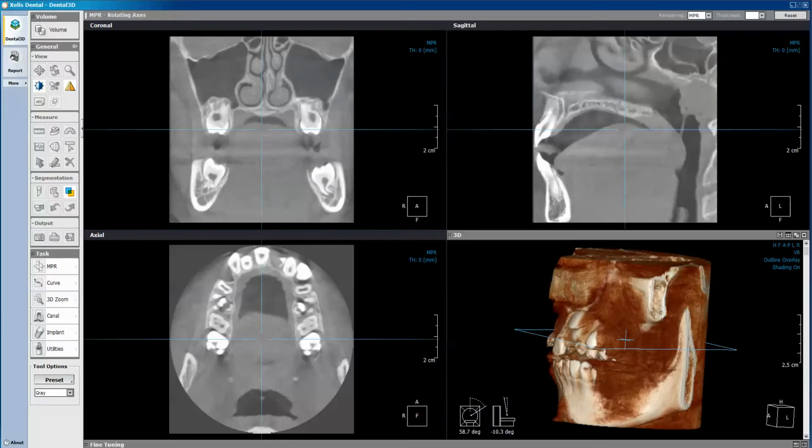The purpose of this tutorial is to educate the end user on how to set the default settings so that every time you open a volume, the contrast, brightness, and the CT world called window leveling will be set appropriately, and the 3D rendering will be set like you prefer each time you open it on this particular workstation.